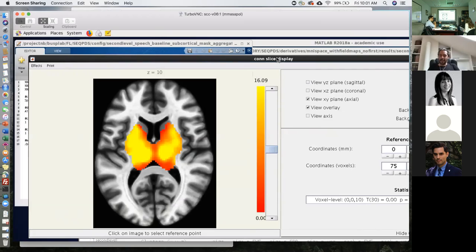The fact that all first level analysis use this implicit masking, and it is determined by an 80% value of the global signal, happens by default in SPM. So it's happening pretty much across all analyses that have been run in SPM. They use that sort of implicit masking in first level analysis. So I use the default settings in that. I'm still using this 0.8 value. I don't know.